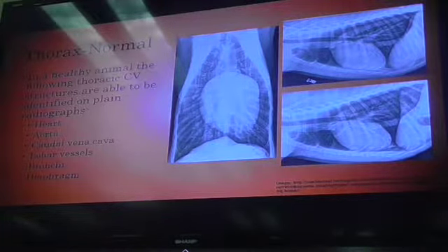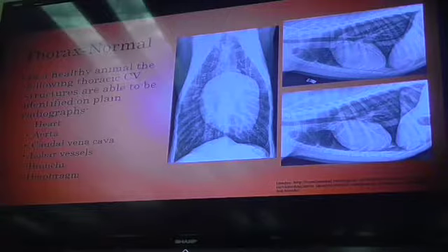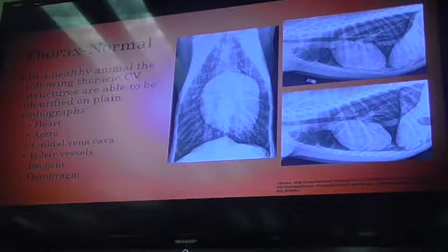Say it out loud. This is a safe place for you guys. Say it loud and proud. Your classmates should not be judging you unless they're speaking too. Because if they're not speaking, then 9 times out of 10, they're waiting for you to say something and then agree with you and see if it's right. All right? So yes, you guys were correct back there. It goes artery, bronchus, vein from dorsal to ventral.